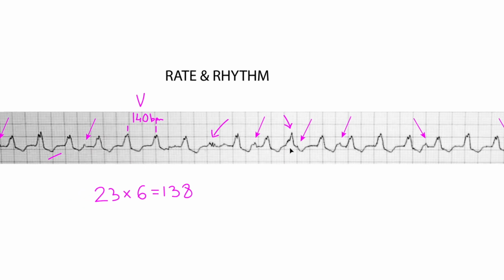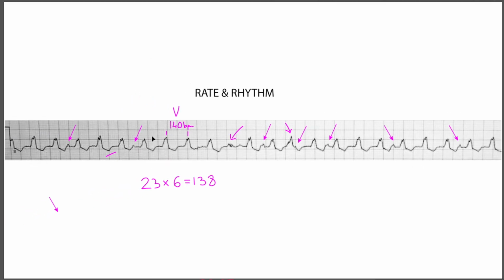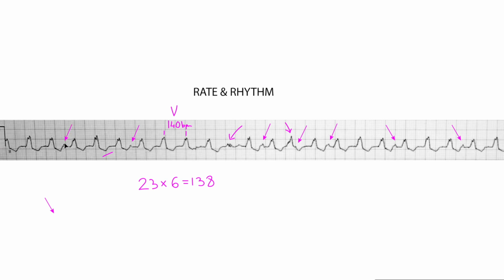Okay, and the reason why I'm doing this: if you're looking at this strip, from this little anomaly to this little anomaly, there's so much of a distance. If we take a look over here, this distance, just eyeballing it, appears to be the same as this distance, same as this over here. This is an eyeball estimate, right? But here, it gets a little busier. So this could be that I'm just getting a truer picture of what's going on supposedly in the atrium. Again, this is an assumption, so I'm just gathering data to help me discern and evaluate what's going on here.